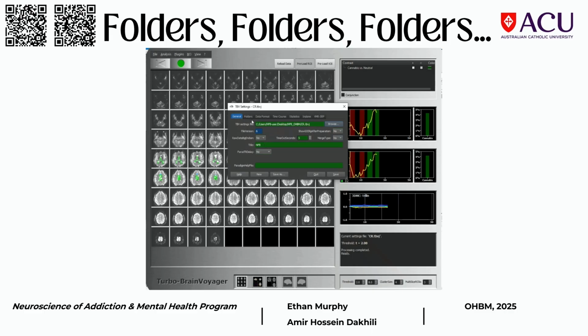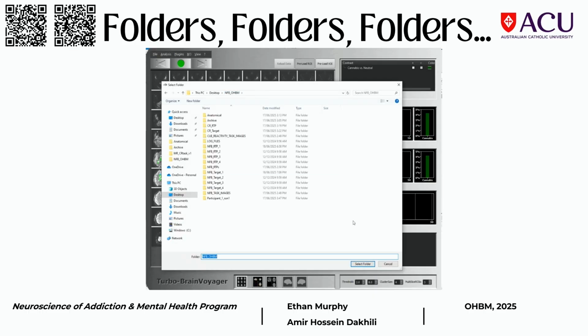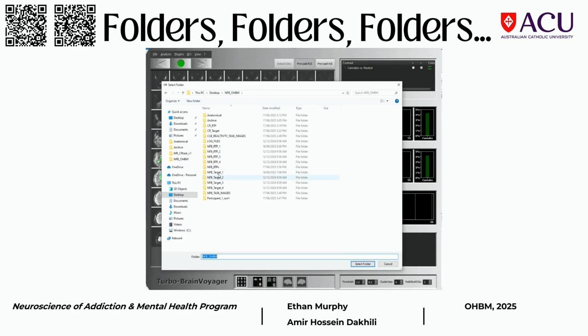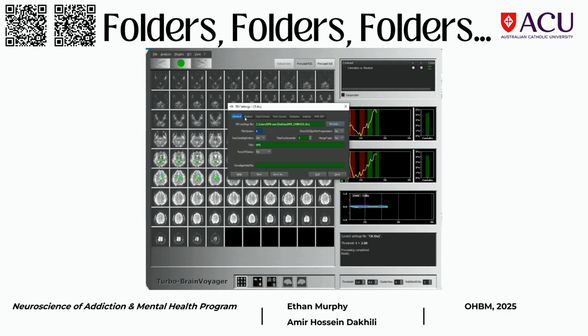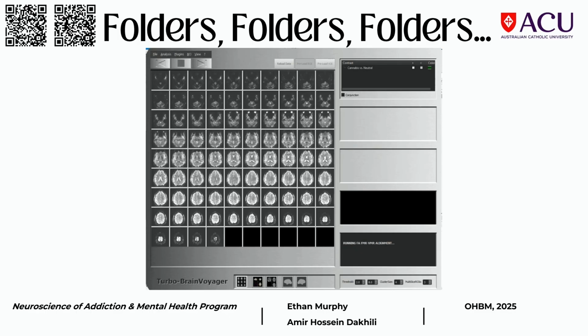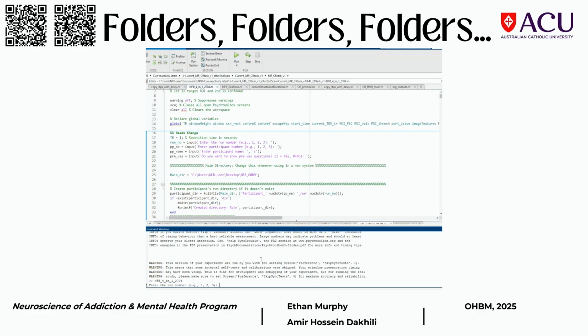So this one is about folders and how many folders have to be correct and right before TBV can actually run. You see that it's happening at the same time.